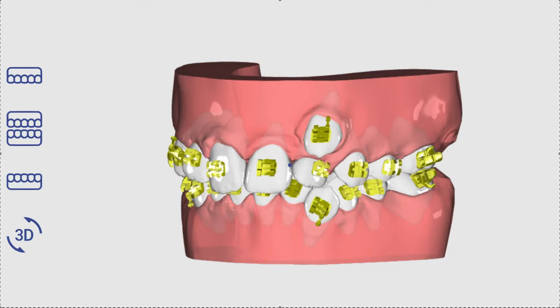There were some other companies I was working with before, but they stopped doing the preview. They say they're doing a digital bracket setup, but they won't give you the preview. And to me, if I don't get to preview the brackets on the teeth, because there's sometimes some give and play here, you're like, hey, this looks perfect to me. By the way, when you get this, you'll be able to look at the top, the bottom, the left, the right, and spin it around. I'm just showing you one static image. But sometimes you had something else in mind.